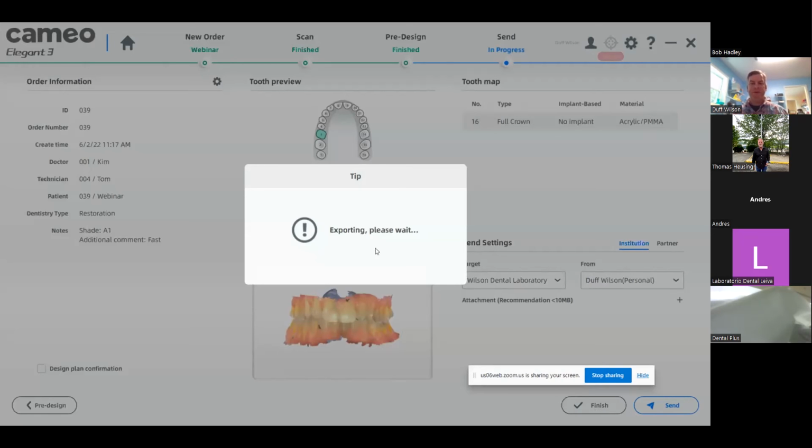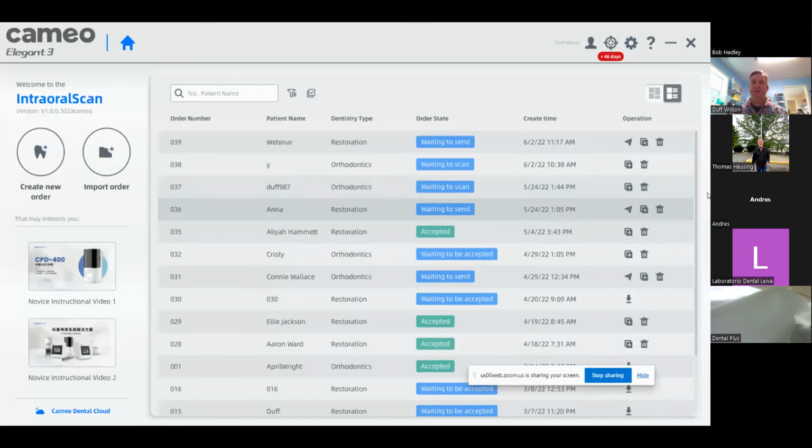So let's see here. It's exporting it right now. And then I'm going to show you a couple of the little setting features, and then I'm going to answer any questions if anybody has any questions, and we can look back at something if one of them needs some reassurance on something. So there it is, webinar right there. It's in my cloud, and everything's good. So I'm gonna go back real quick.